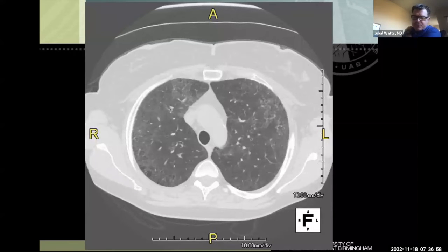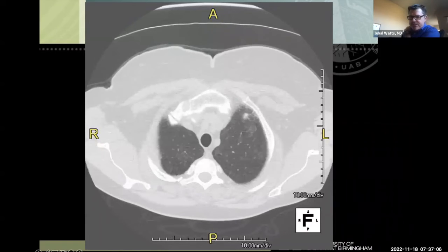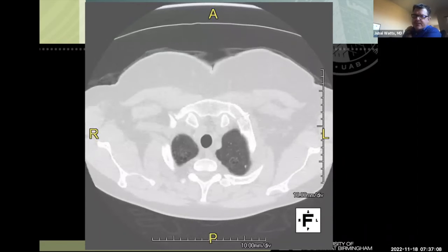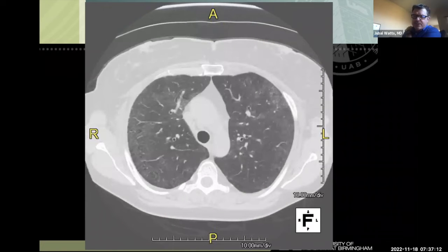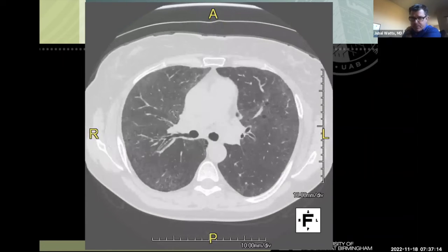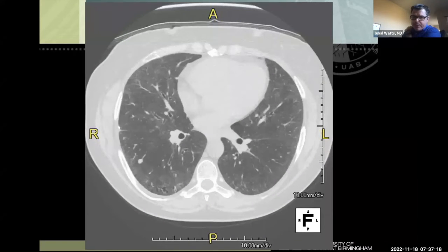Sometimes when there's diffuse ground glass, it can make emphysema look like it has perceptible walls when it really shouldn't, because it makes it more conspicuous. But this is DIP, so desquamative interstitial pneumonia. So this almost always is associated with smoking. People typically have heavy smoking histories. The predominant abnormality will be ground glass. They also have a little nodule there that's probably not related.